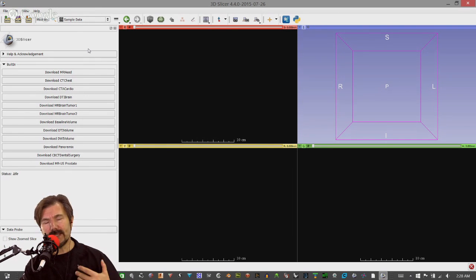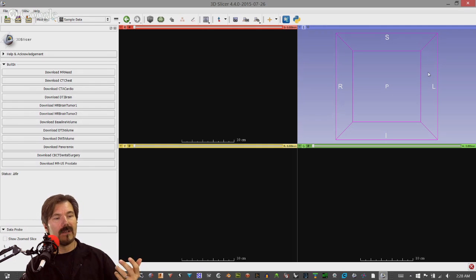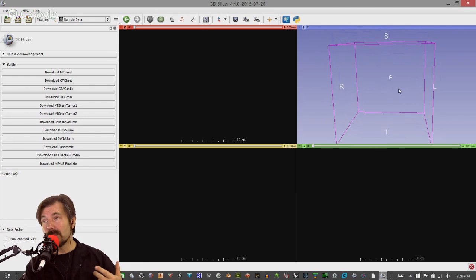original screen that comes up before you make any modifications, and things can be modified. You are greeted with a three-window layout, which is your three views. Jevin, I'm going to keep it basic, but essentially your top view, side view, and front view. And then you also have a 3D view over here that you can rotate with your mouse. This is very important because this is where the actual model shows. Now, I may modify this later on because I like to have a bigger 3D window. But again, all of it is flexible, and we'll go through some of that.